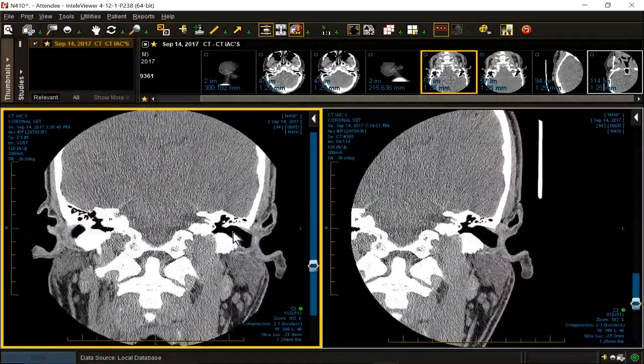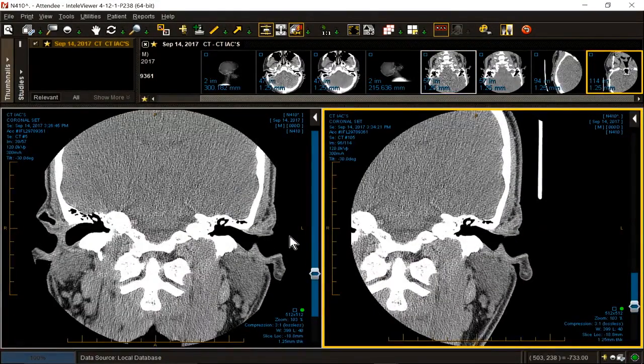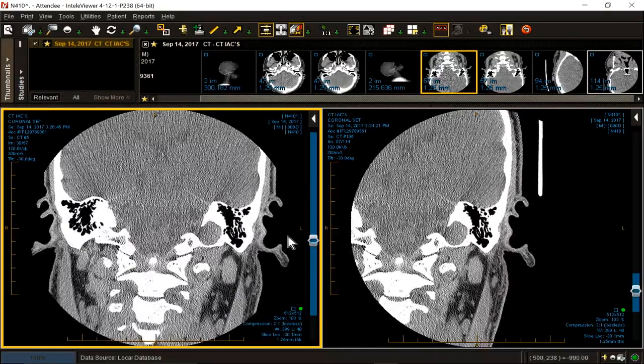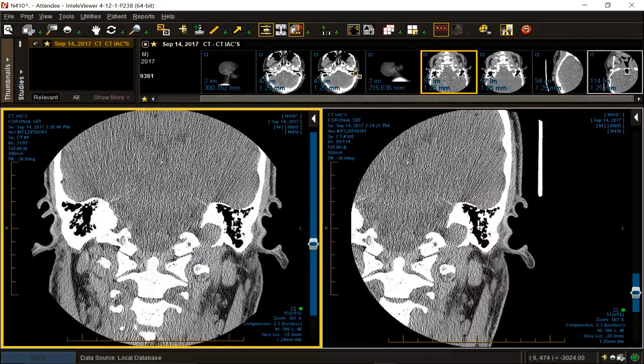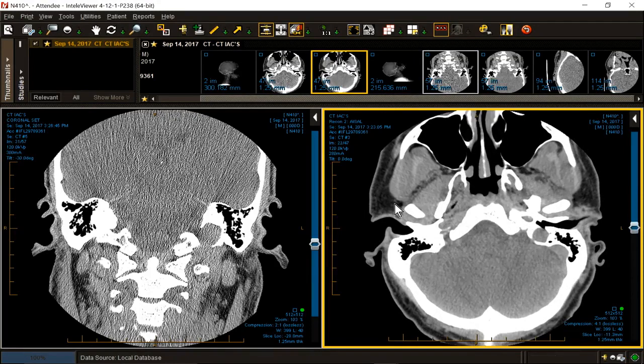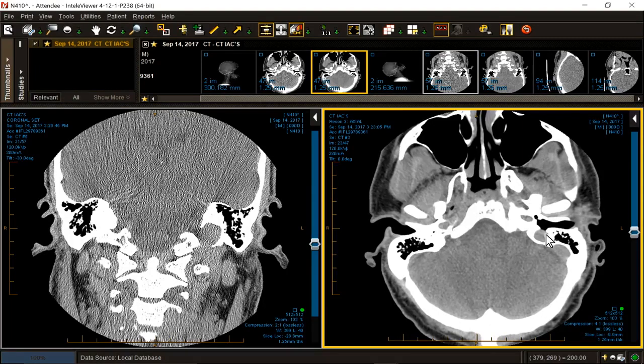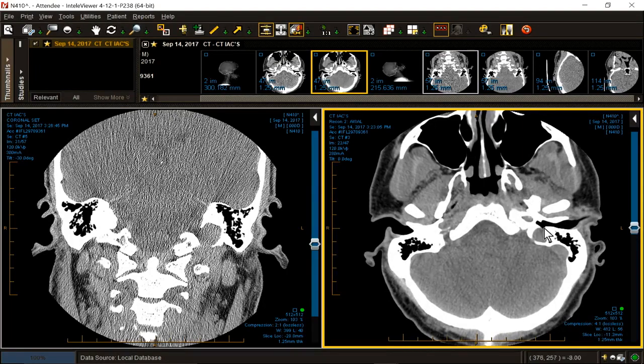The remainder of the middle ear was normal. There was no cholesteatoma. There was no glomus tumor. This is a patulous, slightly high-riding jugular bulb. Let's look at it axially. See, it goes up quite a bit of distance compared to the one on the other side, and there's even a suggestion of a little dehiscence of the vaginal or posterior process of the temporal bone. All right, let's do another one. That's a quick kind of show and tell.